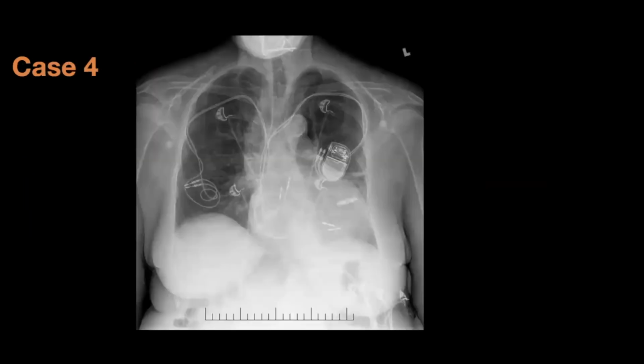This is her chest X-ray. So you can see maybe why there were issues related to the tricuspid valve over time. There was moderate to severe TR noted secondary to the first pacemaker implantation, so she was already aware of the risk when they had the second one put in. I'll get to this in a minute. There's something else also here.